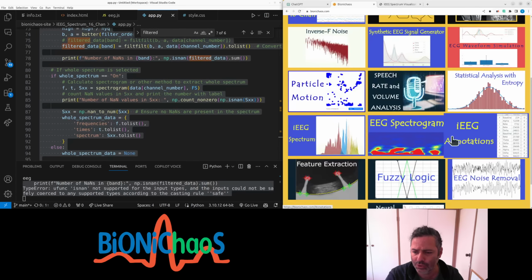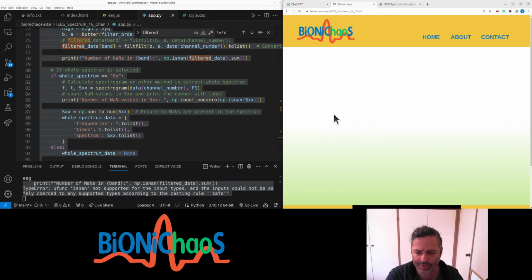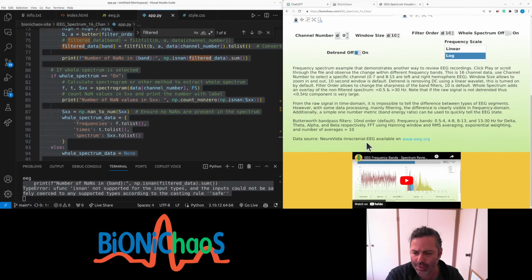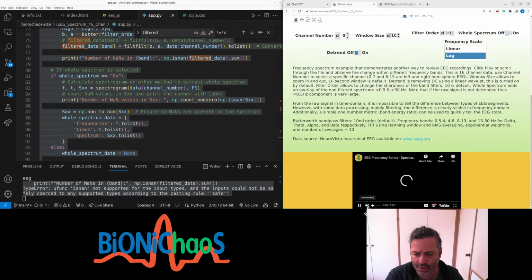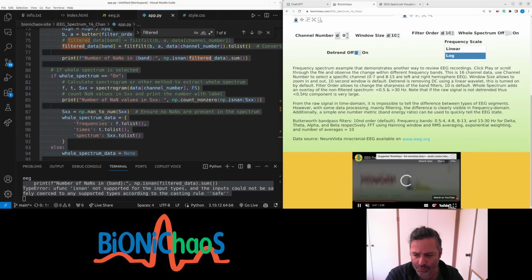So we're doing this tool here. Still have the old version of it. That's how it used to look before the big collapse of the backend. Yeah, we have the video there of how it was meant to work.